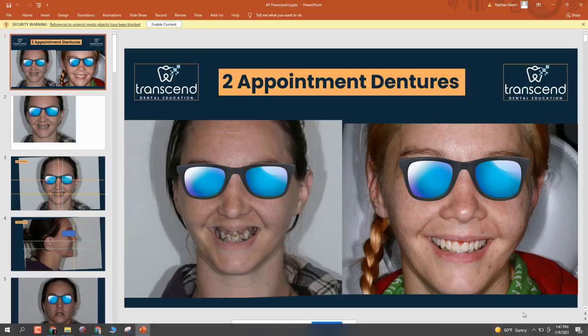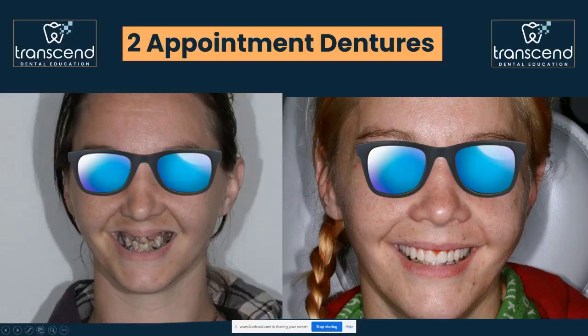But what I'm going to cover today is basically how I utilize a facial scan.